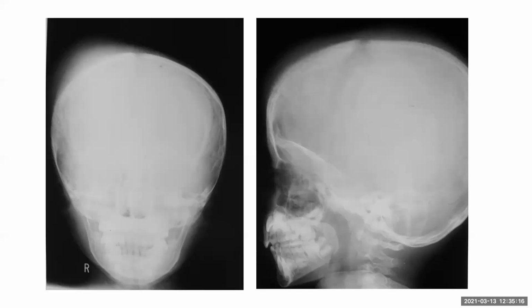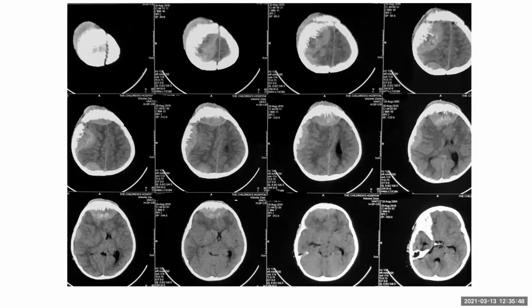My primary differential would be any metastatic process that is going on, or with the spiculated appearance, even thalassemia is a possibility with a hair-on-end appearance of the skull. But the sinuses appear normal, uninvolved for thalassemia, so that goes against it. So I would like to proceed further with cross-sectional imaging or any pertinent history for the patient.